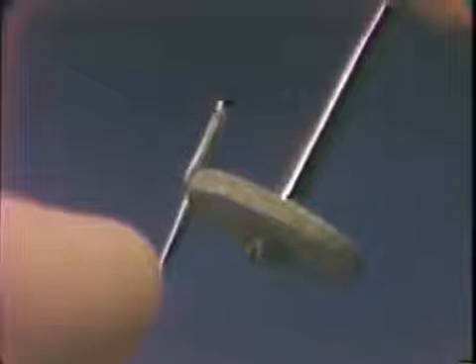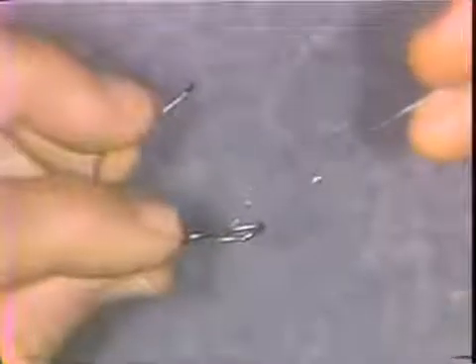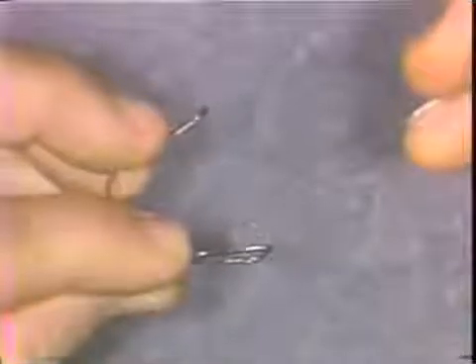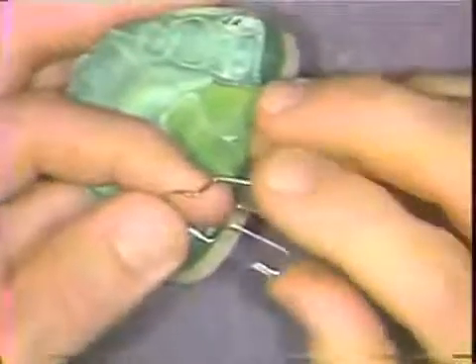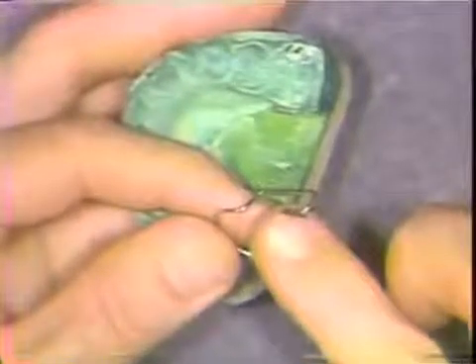This groove provides a means for the locking ligature wire in and around the ground out portion. The ground out portion is completed on both sides of the wire.